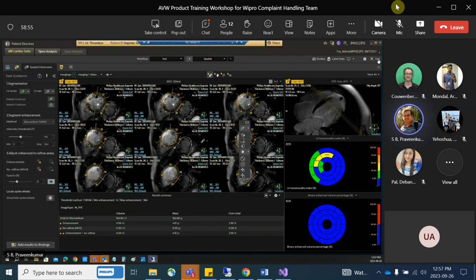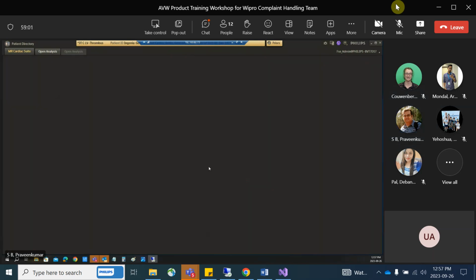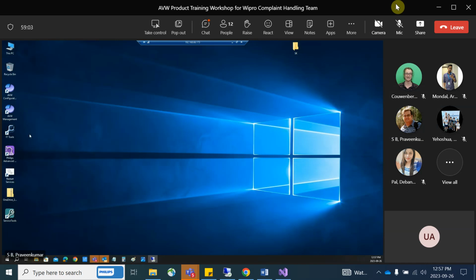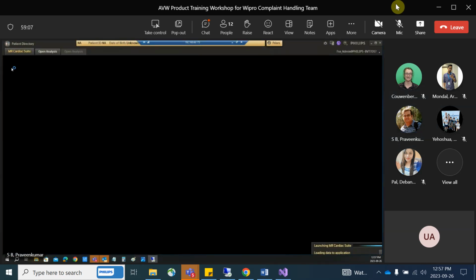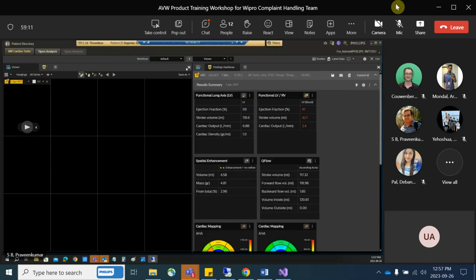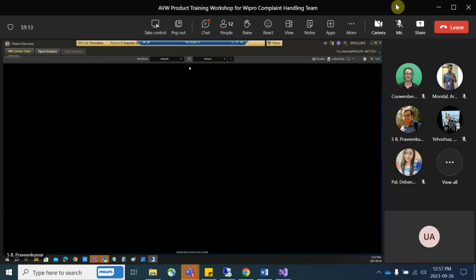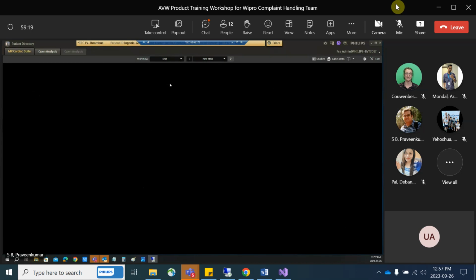So I'll exit this. While exiting, I'll save these results. I click yes. Now I go back and relaunch this. If you want to see that particular workflow you created, click here, test. It will remember everything.